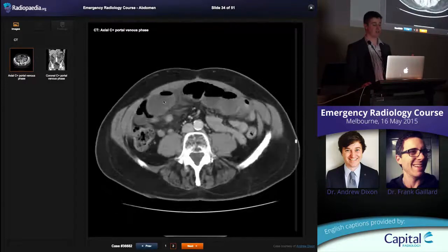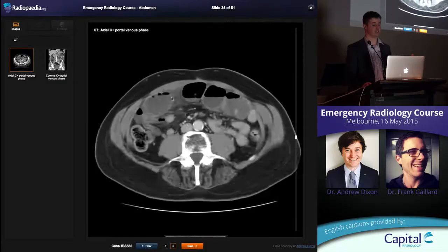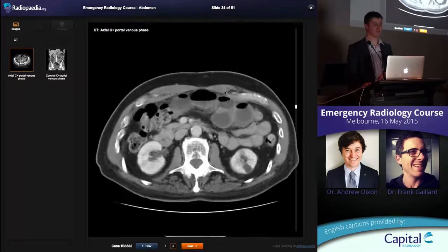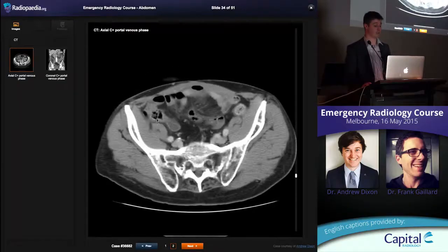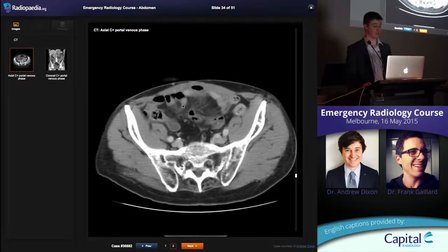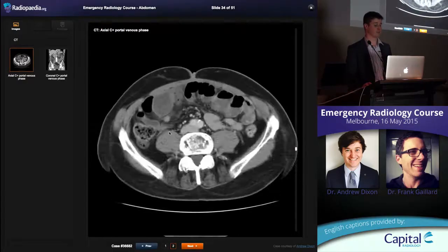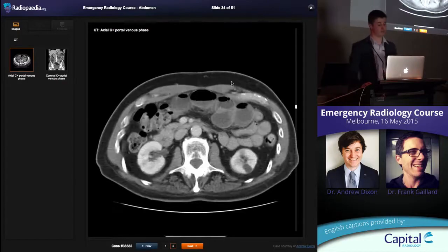You can probably identify why you had that string of beads kind of appearance, because you can see just little pockets of gas sitting up here. That means that bowel's not moving. It's got ileus in it. It's aperistaltic if you've got multiple fluid levels. So dilated. Next thing you do is go down to the terminal ileum and confirm that they're all collapsed. Look at this bowel here, completely collapsed in on itself. So we've got collapsed loops of bowel down in the right iliac fossa. Terminal ileum's collapsed. We've got proximal small bowel, which is dilated. So there must be a transition point.